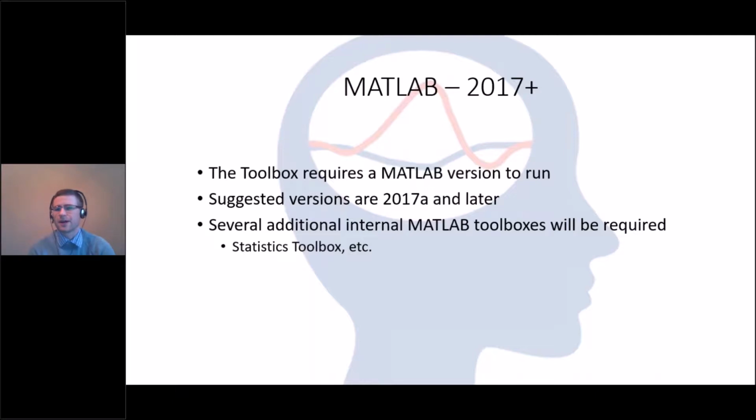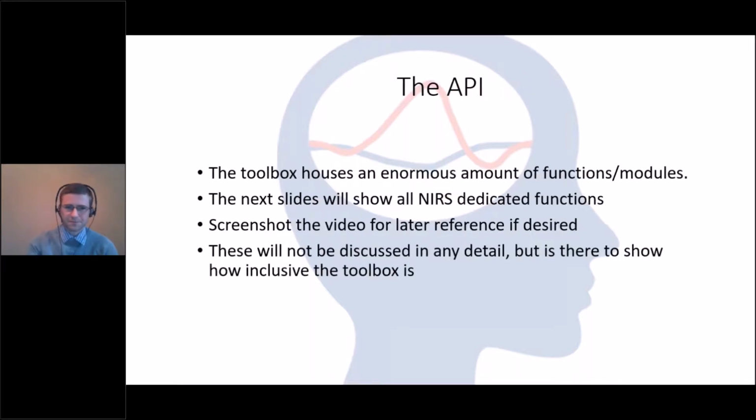You will also need various MATLAB toolboxes in MATLAB. So you'll need the statistics toolbox, I believe the signal processing toolbox, and things like that. Usually when you download it from a university license, these will be included.